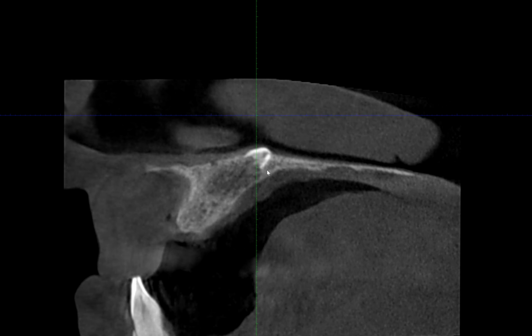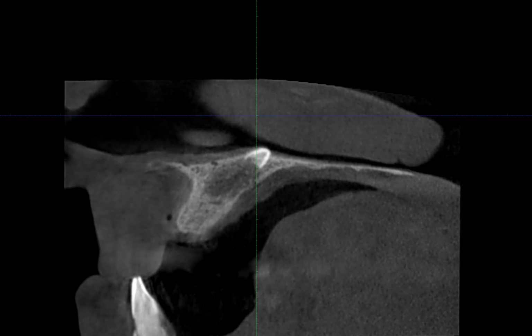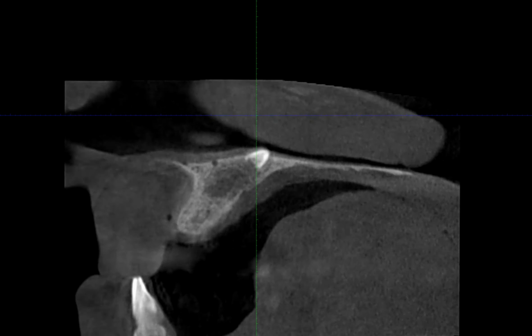Interestingly, this tooth is inverted, right? The crown is pointing superiorly, and although most of its root is resorbed now, I presume this might have been its original outline of the root, something like that. But now it's mostly resorbed and replaced by the bone, and what you have is just a small portion of the crown that's at the level of the hard palate or floor of the nasal cavity.